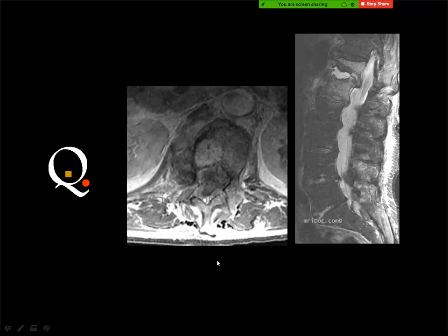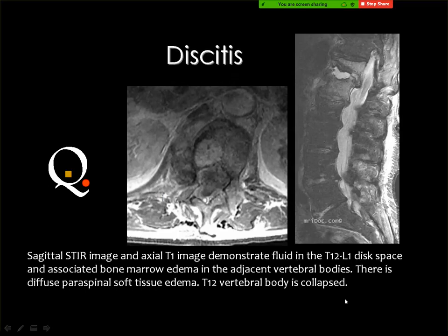Spinal canal stenosis. Discitis. Notice the discitis also. That is 5, 4, 3, 2, D12, 1. D12 on L1, and this is spondylodiscitis. Which fracture, doctor? No, here is D12, and this is L1. It's eroded by the inflammatory material, and the disk space is very bright.